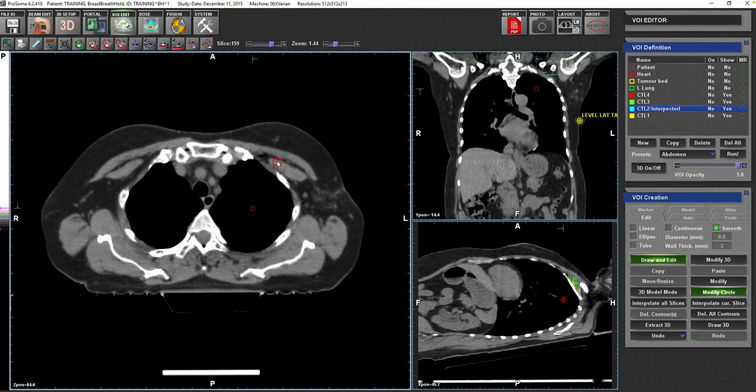And then here I will draw level 2. How do you draw it? I draw the interpectoral group, which is this group, but as I said, I take level 2 with me, which will include the muscles, and posterior to the muscles, and edge to edge of the muscle is the medial and lateral border, and that's it. Yes, that's it. I will do that now.